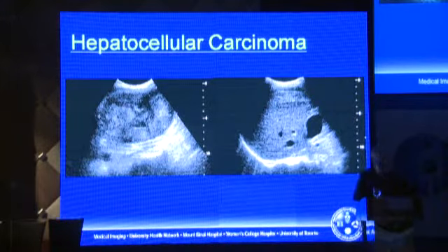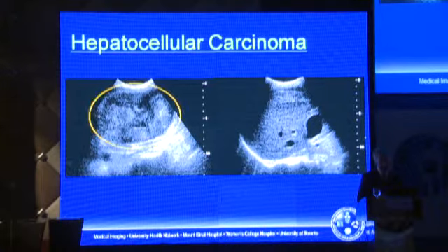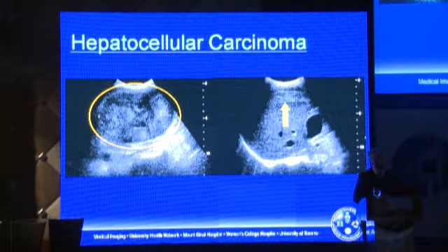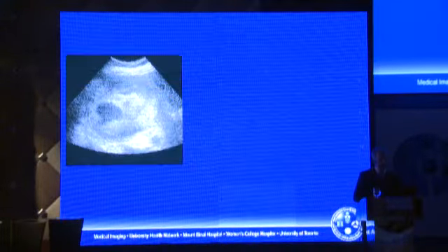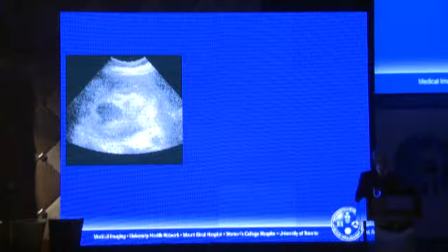On the other hand, this patient has a history of chronic hepatitis for 20 years. Similar presentation. I'll show you the ultrasound images here. There was a mass hanging exophytically off segment 5 of the liver, and this is at one appearance of acute blood in the peritoneal cavity, quite echogenic, heterogeneous, so we were quite comfortable making the diagnosis here of a ruptured hepatocellular carcinoma with hemoperitoneum.